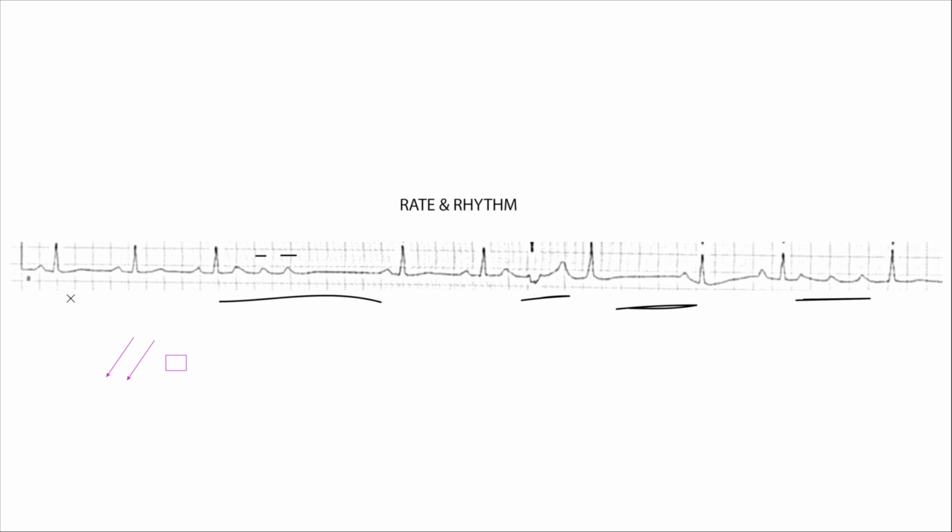So just looking at this, I'm trying to really find a good starting point. And of course, you can always go back on your method, and that's exactly what I'm trying to do in my head here. Where do I start? So I'm going to start with these few beats here at the beginning, right? These look pretty normal when I take a look at them from here to here. So this is just a quick eyeball to get the heart rate.